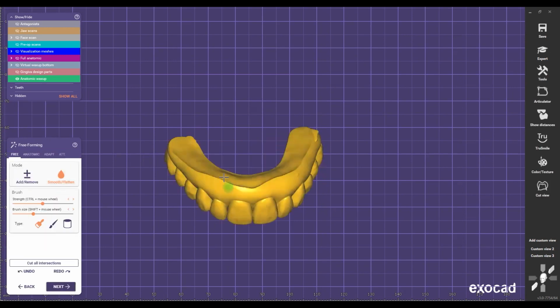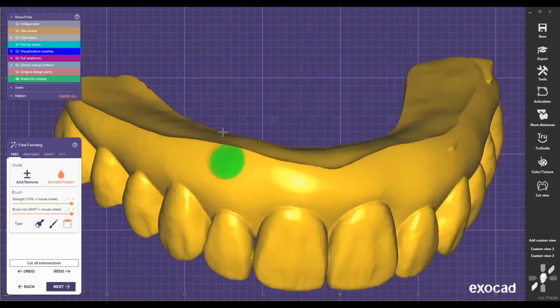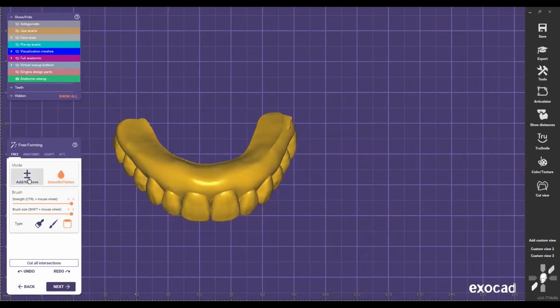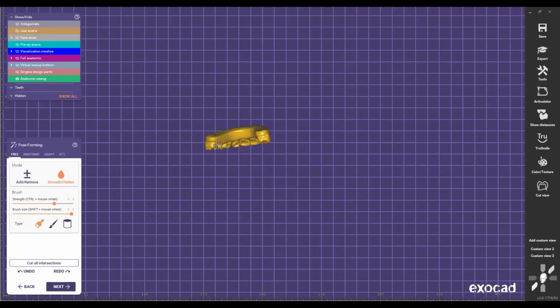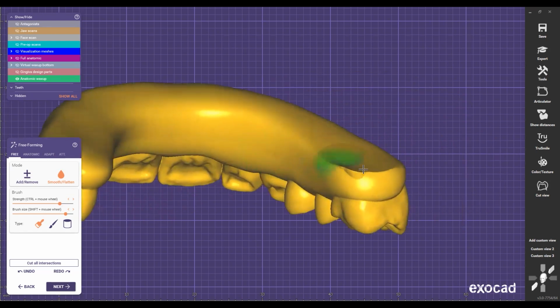Then I can just start creating a nice ideal shape here, because remember, they're gonna cut bone, and I just need to make a nice ovate pontic shape here. I want to leave it ready, close to how the bone is gonna be, and I need to make it flat and even, because remember, when we do these cases, the surgeons make a flat cut on the bone. So that's why we need to make this flat, because we cannot leave it bulky or anything like that, right? The way biology works, it's gonna just follow this, and then tissue is gonna form to this nice shape. So 3 to 6 months later, that tissue is gonna look beautiful.